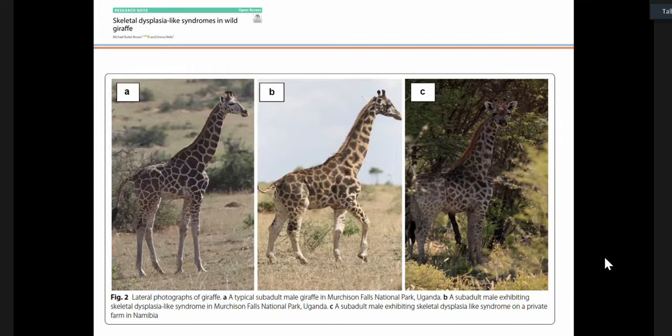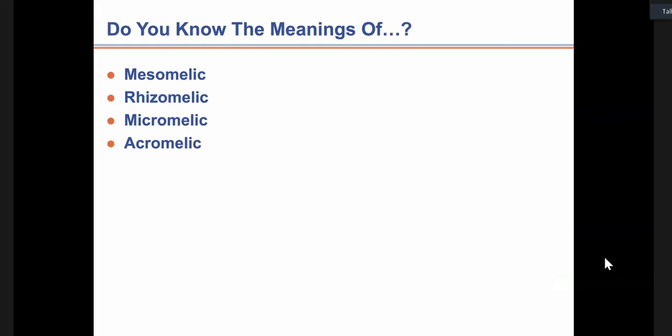So generally speaking, it's all about pattern recognition. And if you can identify which aspect of the child, which aspect of the radiograph is abnormal, you at least have a beginning. Is the child overall small but proportionate? Is it a short trunk, or is it a short-limbed dwarfism that you're dealing with? And really, it's excellent if you know which pattern. It narrows the diagnosis for you.